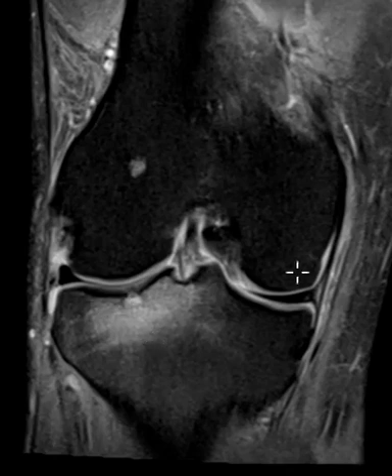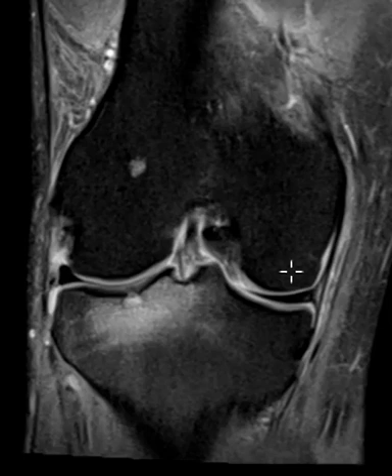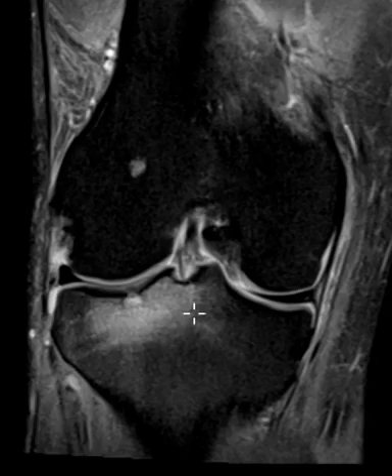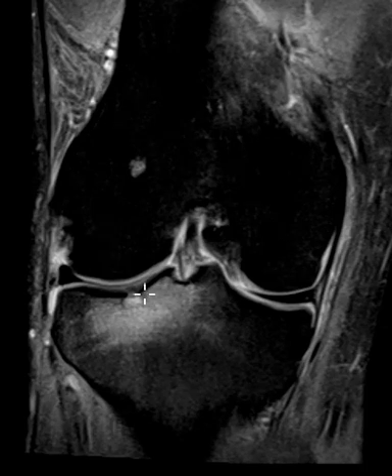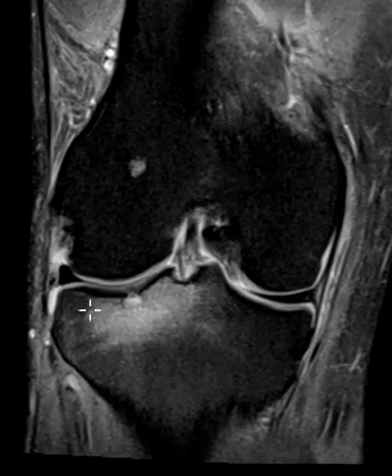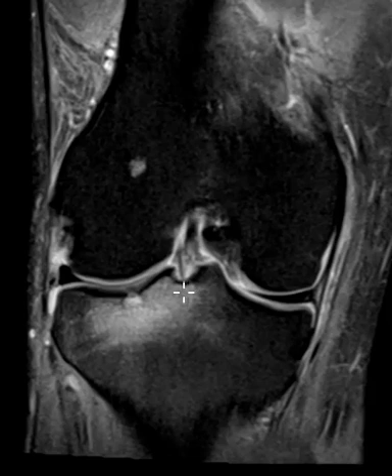Now this patient had no prior trauma, and the question is, what is this thing? This does look like an osteoid osteoma. An osteoid osteoma is a benign tumor. You can have a little central nidus like this. It usually involves the cortex. You see a little round ball just like this. You see a halo of marrow edema around it just like this. So this is what an osteoid osteoma could look like.